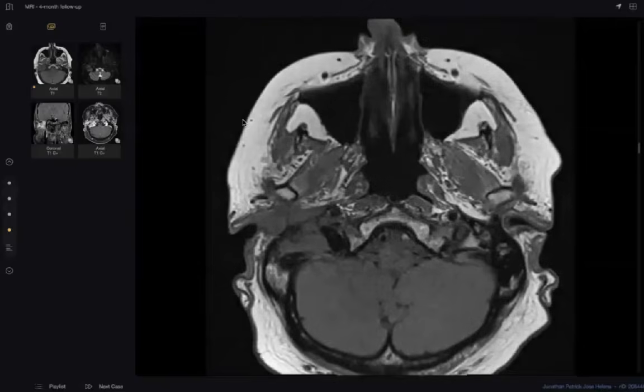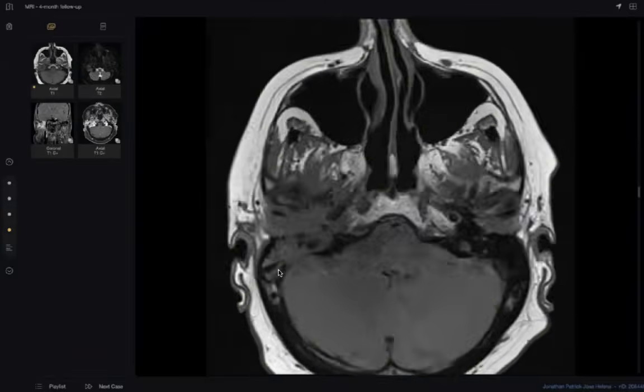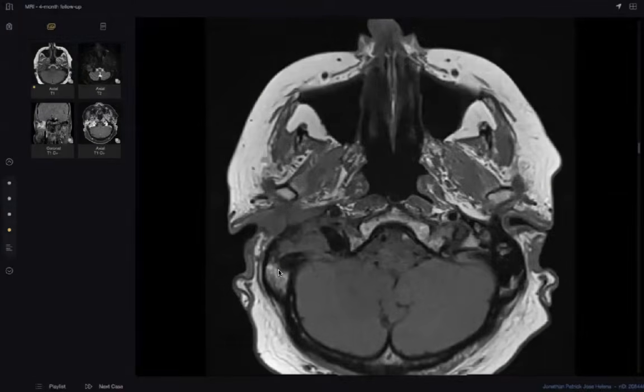Which structure are you very worried about? The nerves. What else? Look at the mass first. So the carotid artery. However, in the region of the occipital bone, what is the name of this structure, which is markedly compressed or maybe infiltrated? Can you show me again, sir, please? This one. Yeah, this is the jugular. Yes, the sigmoid sinus and the jugular vein.